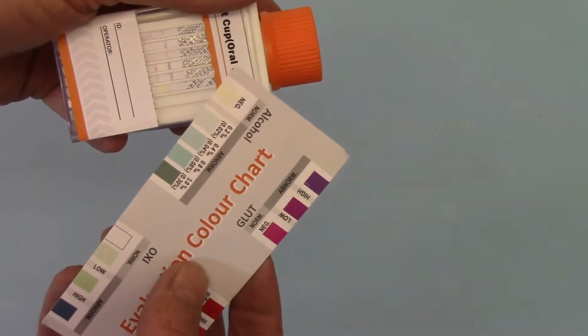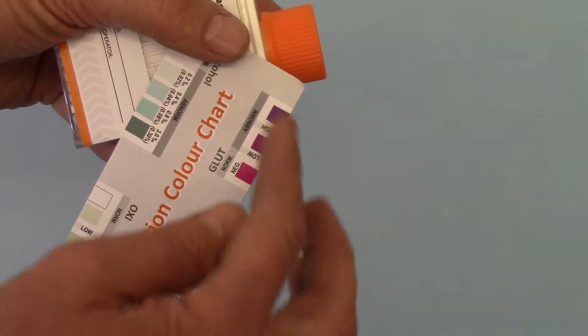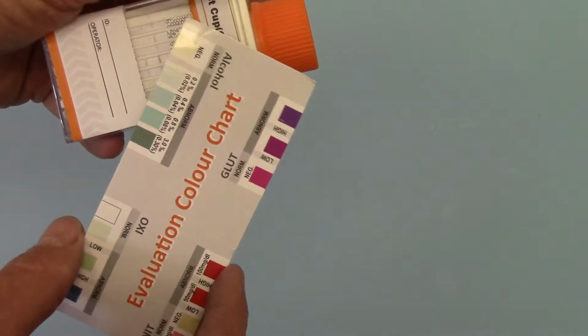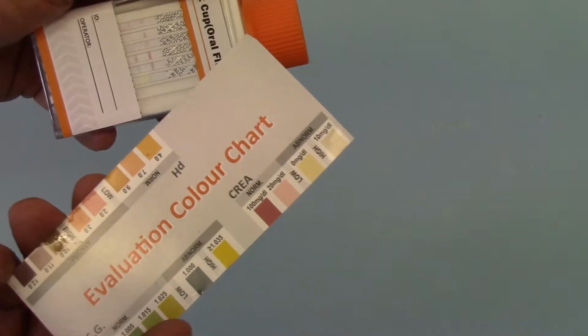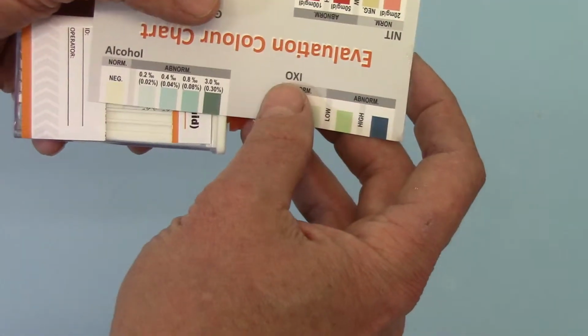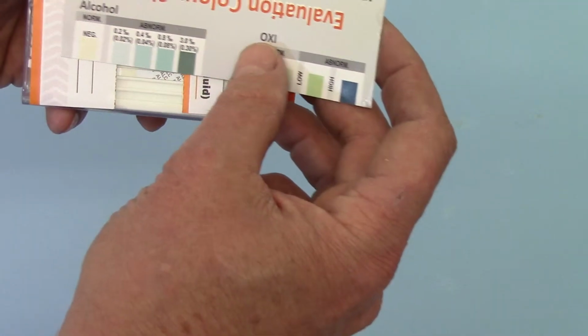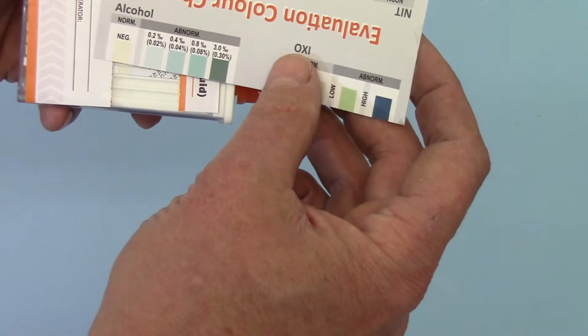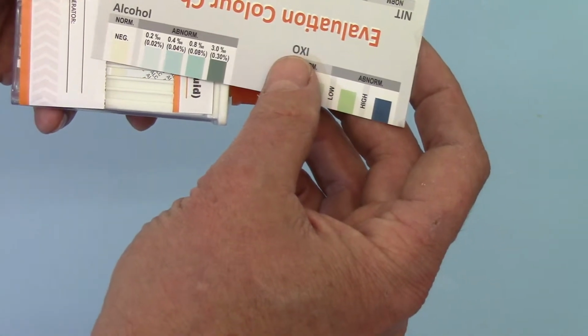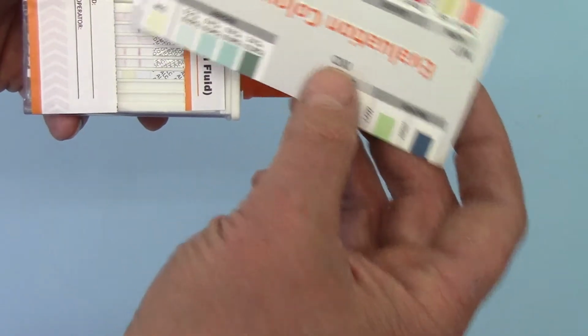Now, supplied with each test will be an evaluation colour chart. Now this is a universal card used for the full 6 adulteration tests which are on urine packs, but also the saliva alcohol test which we have here, and it basically is a comparison of the colour change against these charts to read the indicative equivalent blood alcohol level. And you see this is a negative test where the match is with the normal or negative alcohol reading.